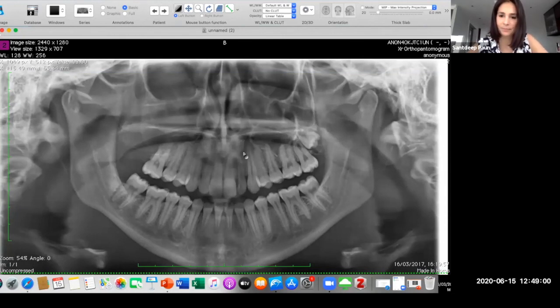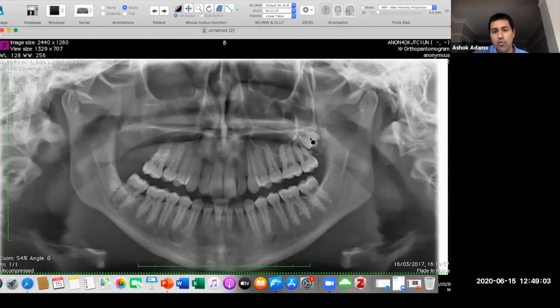The key is when you guys are looking, you should always have all of your maxilla, all of that maxillary dentition, on your CT sinus scan.